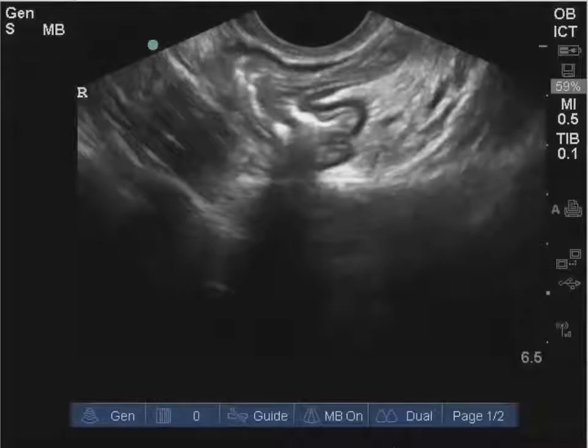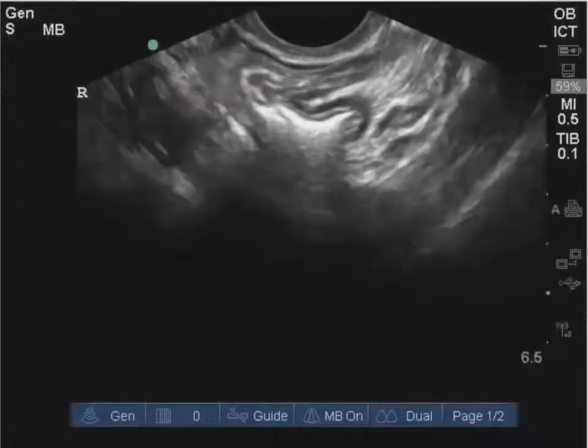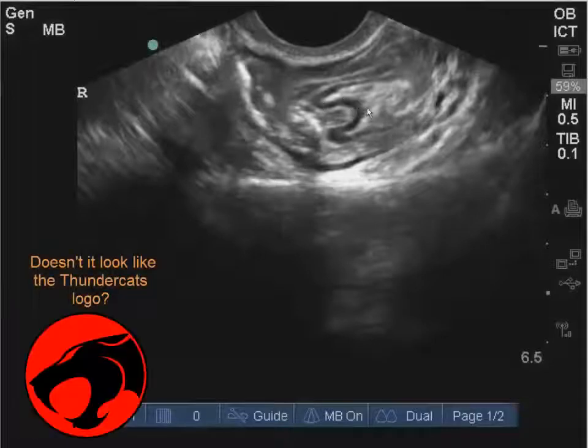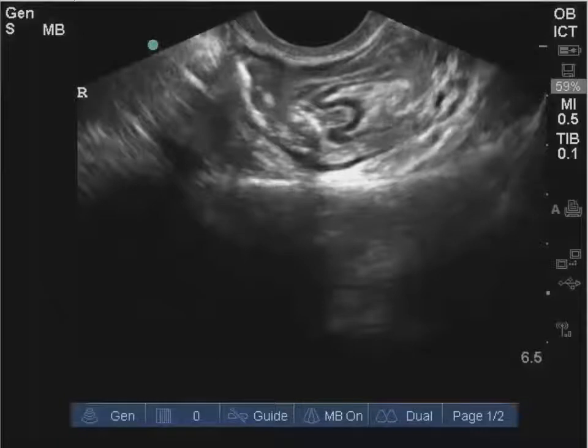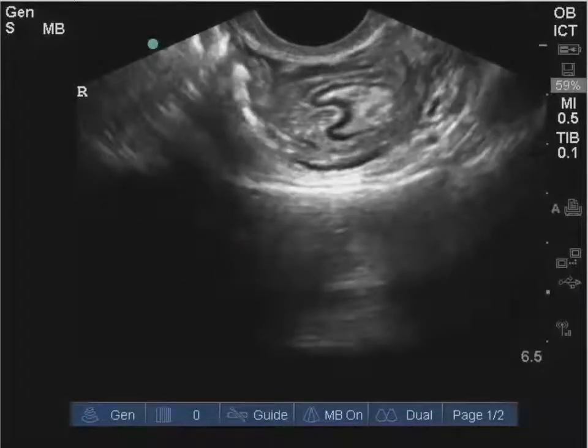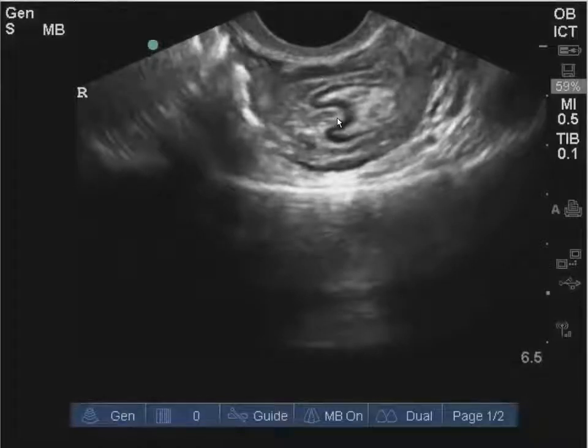So right here is one of the areas that I think is pretty interesting and pretty telling as you fan through. Right here you see a bunch of these different folds here. You see fold, fold. You almost get an idea of, it looks like maybe a snake is eating a mouse or something like that. So let's go ahead and keep scrolling through, and right here, so here we see something that's got a lot of different layers. You still see that kind of something sitting inside of something else.